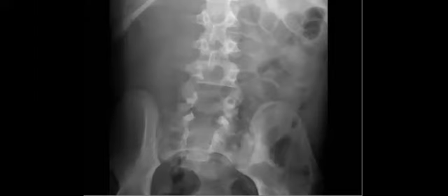Neuroblastoma associated with the skeletal abnormality. Maybe. Nice. What else? With spina bifida or a defect in the anterior spine, I put anterior meningocele. Good idea. Very nice idea. Nermin? Marwa or Nermin? Both are stars, but okay. Nice suggestion, Marwa. Okay, thank you. Yes, good suggestion.